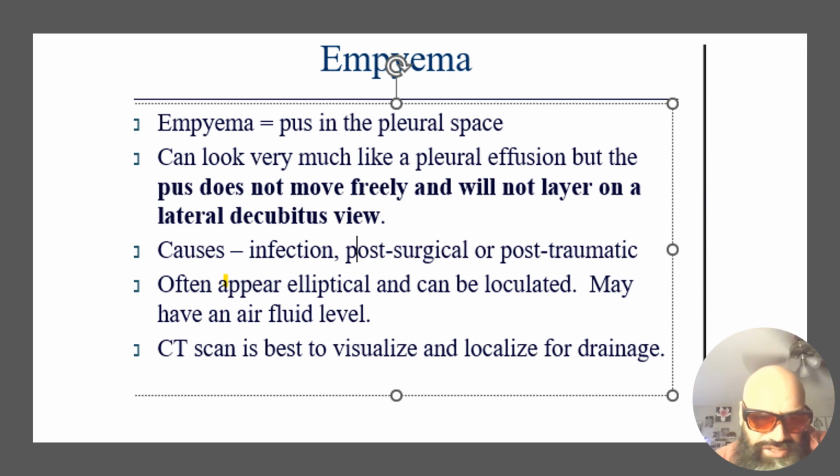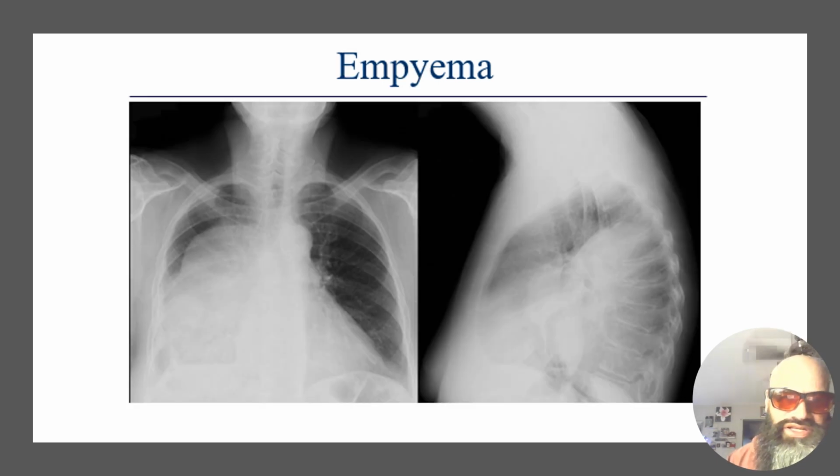But we need to obviously look at this condition further, specifically if we have empyema in our differential. A CT scan has better technology to localize and give you a 3D image of the empyema. So that will be a next step. Then we get interventional radiology consulted, and they will do a fluoroscopic guided needle aspiration of the empyema.